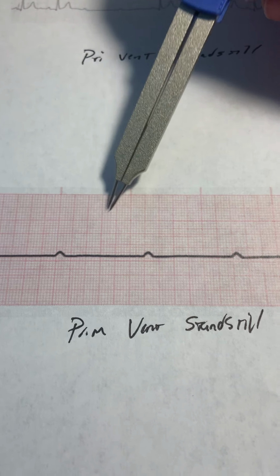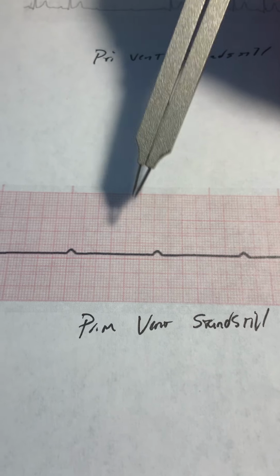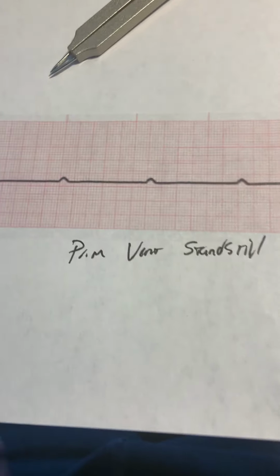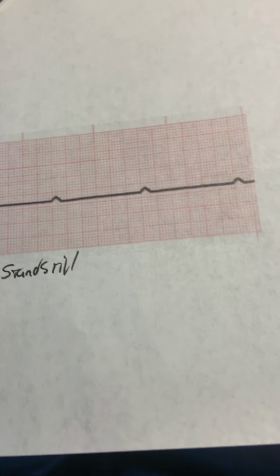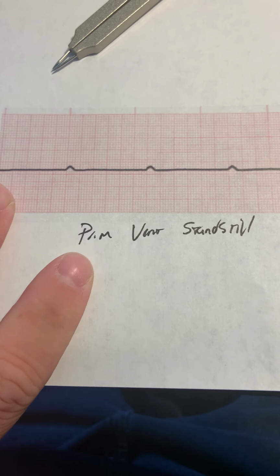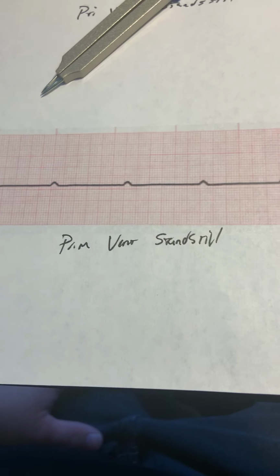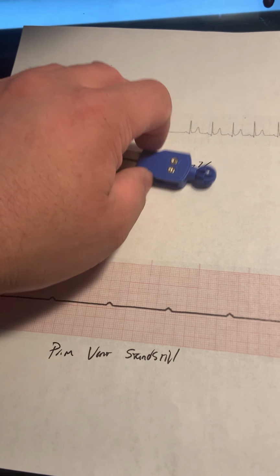Again, this person is treated with CPR, maybe paced, if you have that capability, and work them like a cardiac arrest, because that's what that is. Sometimes you'll see runs of this, and I have, where the patient will just show this for like 3 seconds, and then they'll go back into a sinus, kind of like this guy did, but a lot longer.